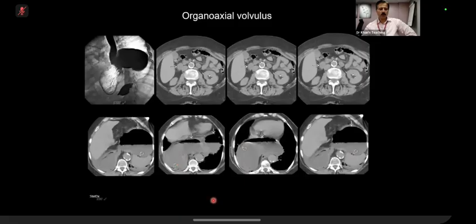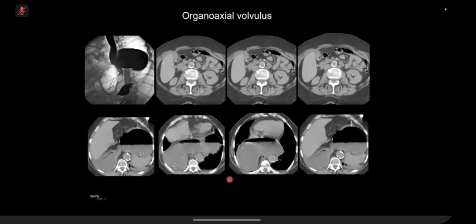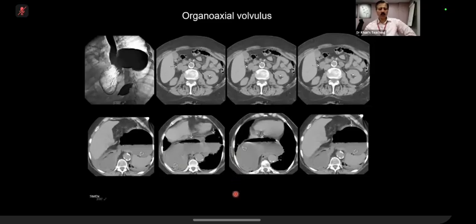And these foci of air are intramural air. Candidate 4, what does it mean? What is happening? There's air in the wall, so impending rupture or perforation, pneumatosis intestinalis. Right. So this means that the volvulus has strangulated and there is ischemia. So there must be a twist of more than 180 degrees. And now it is impending perforation, or there might be a bit of perforation because there are some bubbles which are sitting outside.